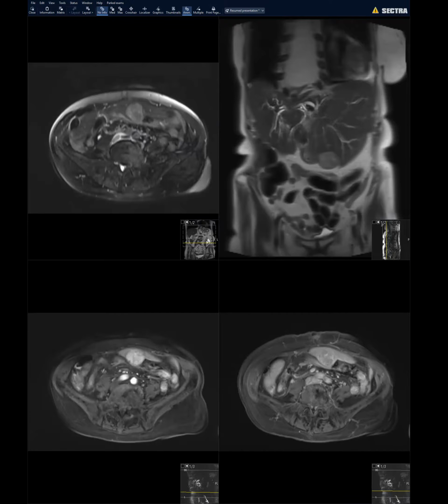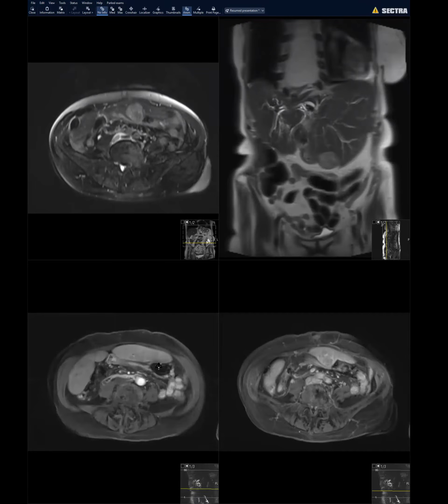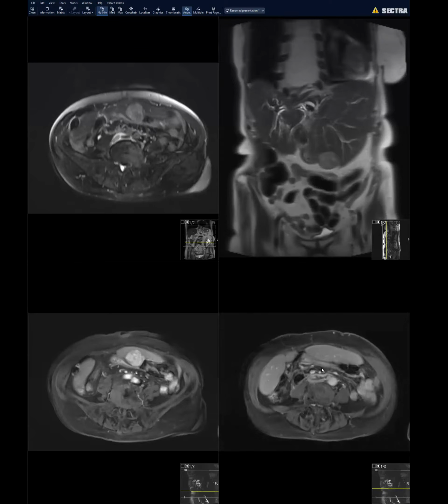Sort of an unusual thing for a met. Yeah, it didn't look like a classic met when the primary is not even seen well. And yeah, unless neuroendocrine sometimes does that. So when we reviewed the history a little bit more, this patient was Hep C positive, but obviously the liver doesn't look very cirrhotic. So because of arterial enhancement and washout, we questioned HCC rather than a metastatic lesion, and that's what it turned out to be. It turned out to be a well-differentiated HCC on biopsy.